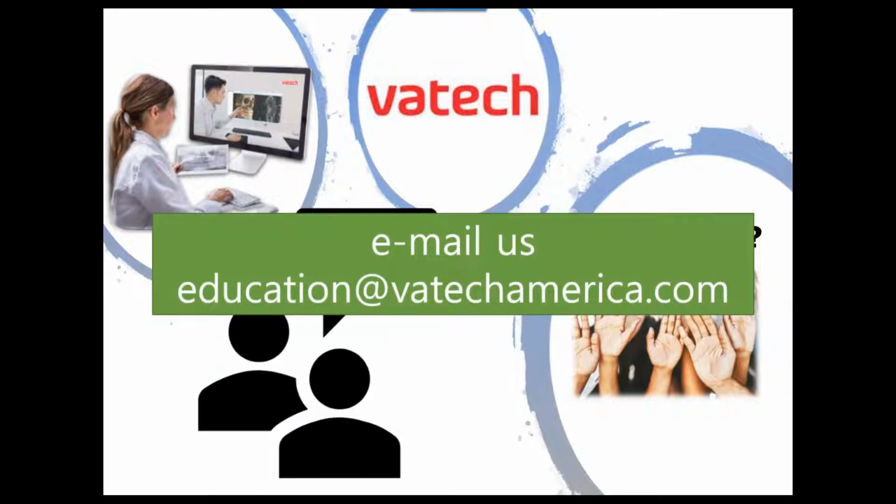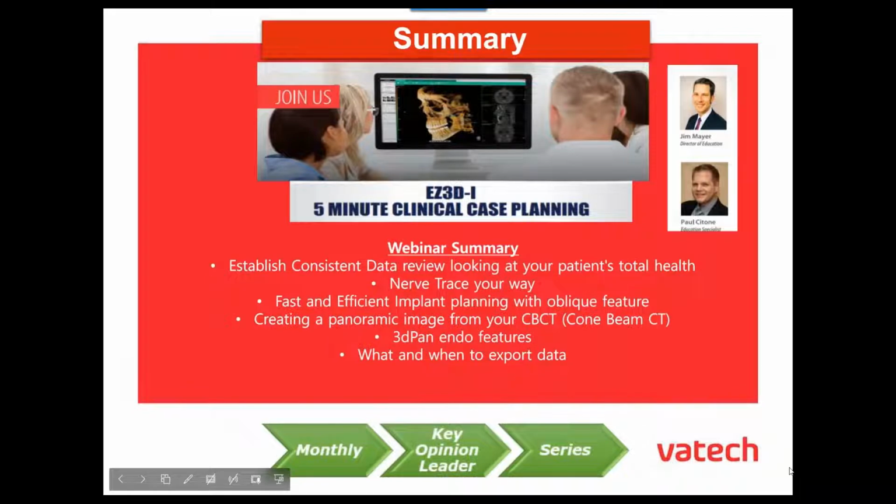So just kind of in summary here, we took a look at the scan kind of from top to bottom, total patient's health. We focused on how to trace the nerve. We talked about fast and efficient implant planning with oblique included. We talked about creating a pan image from your CBCT, 3D pan, and also endo features. And then we finished up with how and when to export data and taking a look at that. So we had a lot of features in there today.